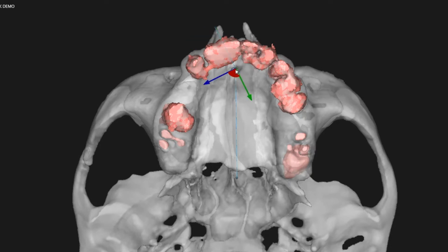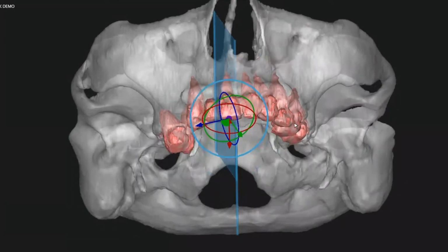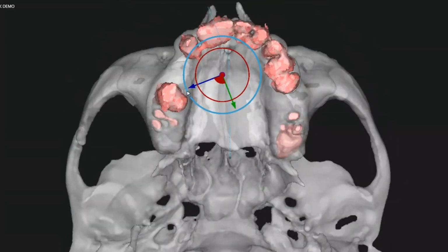from where the upper left 5 is to the upper right 5, you've got the last standing premolar on the left. So if you draw a straight line in the transverse plane posterior to the 5 going to the other 5, you imagine resecting out the entire.